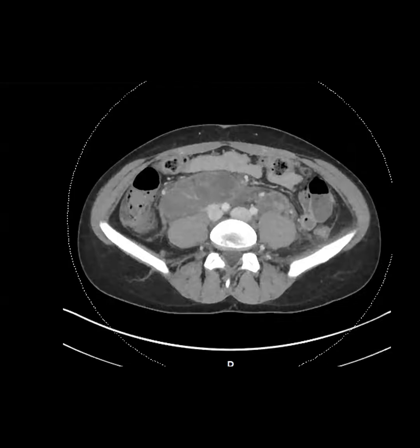One thing that comes to mind, that I've seen in the mesentery like this, is a plexiform neurofibroma. Another thing, because you showed that paravertebral soft tissue, is extramedullary hematopoiesis, although it's usually coming out of the bones, not just retroperitoneal like this. Sure. And then necrotic nodes, we think about TB. Those are excellent thoughts.